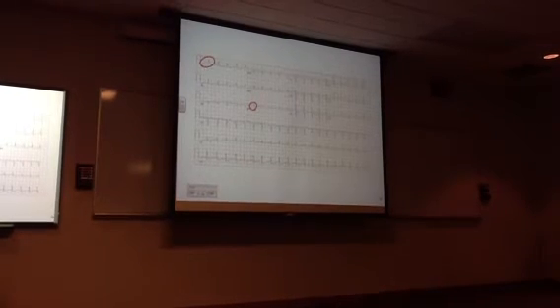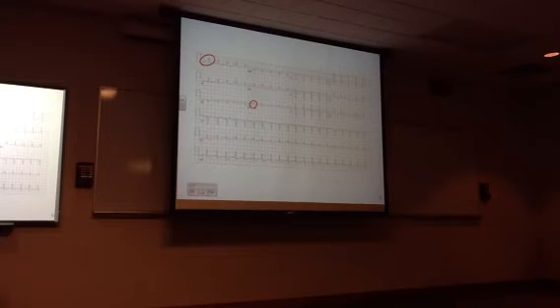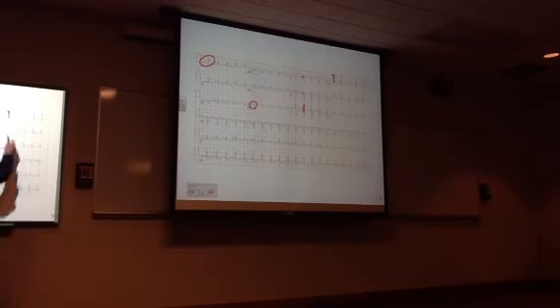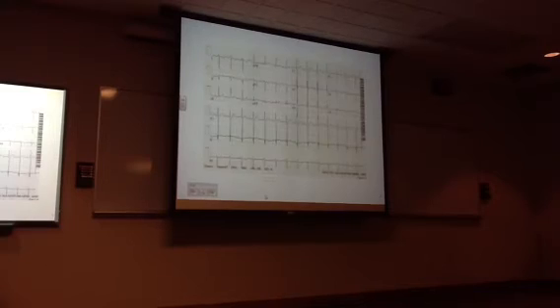That's right. Anybody see anything? How about R wave progression? In V1, we have mostly S waves. In V4, we have mostly R wave. So there is R wave progression here. There's very little R wave here, more R wave here, more here, more here. Look at the T waves. Inverted. Yeah, so what about T waves? They should follow the direction of the QRS. So there's something going on there, and we'll see that in a little bit. So this is not a normal EKG, and Justin has reason to be concerned.